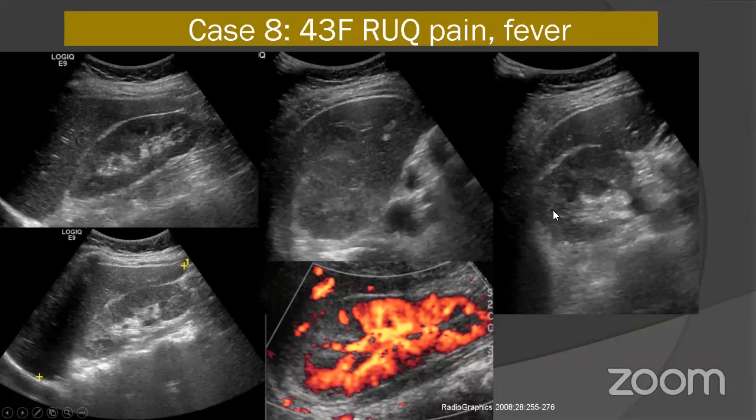And you contrast that with the axial image of the lower pole of the right kidney. And there is loss of flow within this region, or diminished flow, I must say. There is no fluid collection per se. And as I mentioned, this finding was missed.